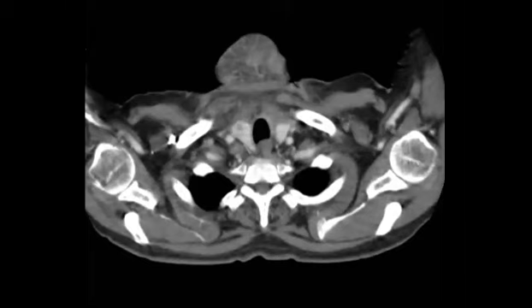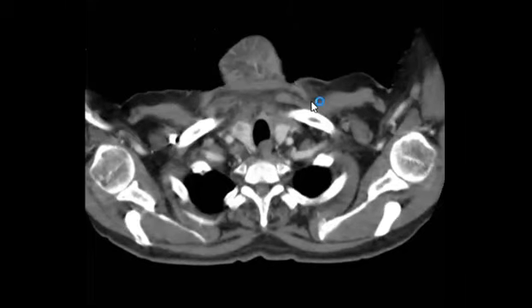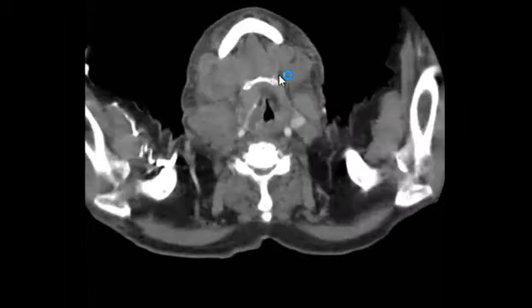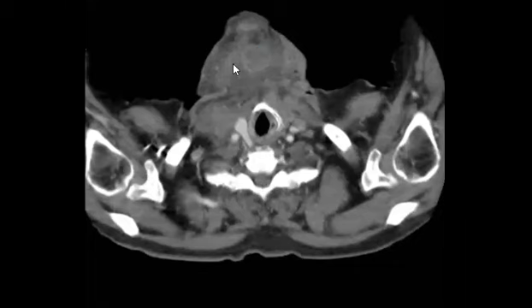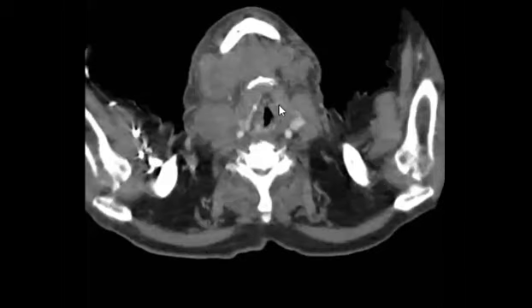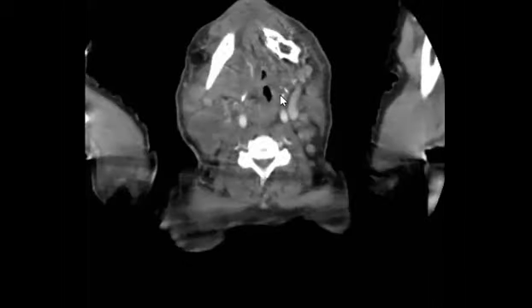I'm checking if there is any addition. Until now there is some missing finding, but I'm trying to open the way with you. Yes, some of them are necrotic. This is a very nice point that you should mention, and it has marginal enhancement. Then this is what I was waiting for you to mention, this mandible. Do you see it in the bone window?